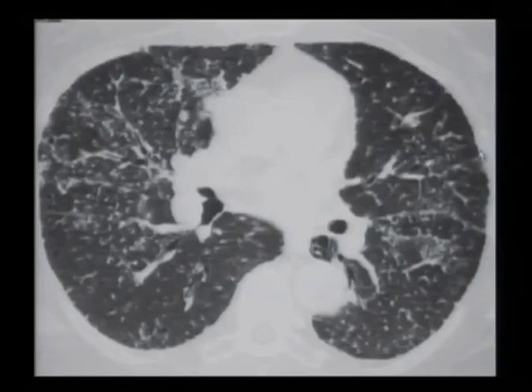You look at these nodules, like Rick mentioned in his talk, and I'll mention as well, you can see these nodules are touching the costal pleura, and they're all along the fissural pleura as well. So you know right off the bat that this is not going to be a centrilobular predominant process. This is going to be perilymphatic, or it's going to be random.